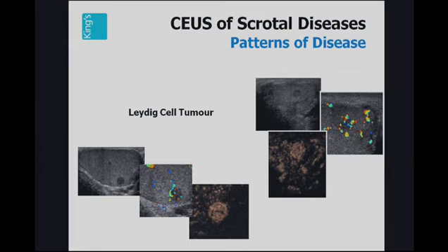In this case, it's important to ascertain that this incidentally discovered low reflective abnormality in the testes is vascularized. This will allow the appropriate management either to watch and see what happens to this lesion over a period of several months, or to allow surgical resection under ultrasound guidance.